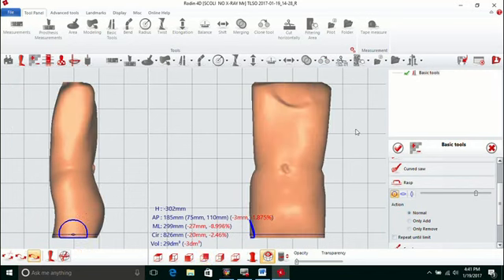and now we'll go to posterior view, and I'll show you the only add. So what I'll do is, this is actually a dip from a t-shirt, but I clicked only add. If I left click and hold down and go over that area, it's filling in that little valley. Now you see the little posterior, that's where the transmitter is. If I use only remove, left click, hold down, that takes that down as well. Now I can go back to normal and continue my blend or my smooth.